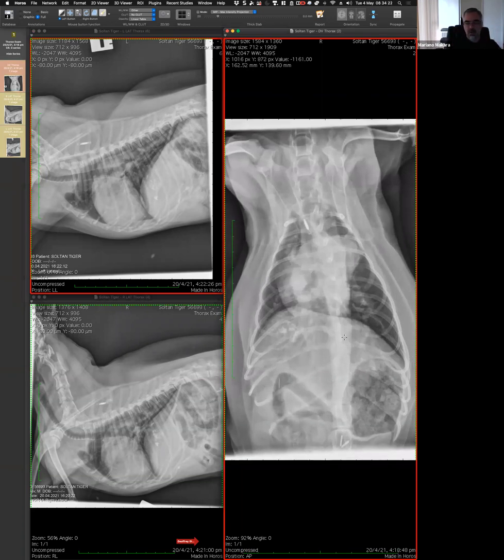So out of the other comments, I agree with the enlargement of the right ventricle, enlargement of the pulmonary outflow tract. I love the comment and the assessment of the size of the liver and the fluid, because that is not telling us that there is no right-sided heart disease. It's telling us that there is no failure, but there still can be right-sided heart disease. And now, then we went into the problem of the expectation of having the arteries being abnormal and seeing the veins being abnormal.